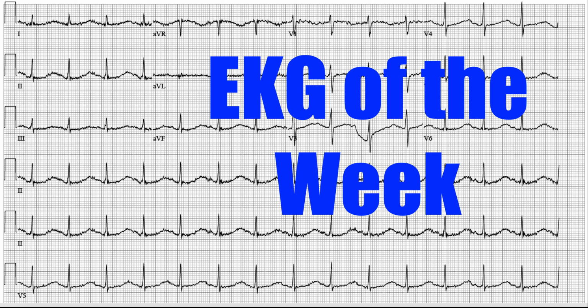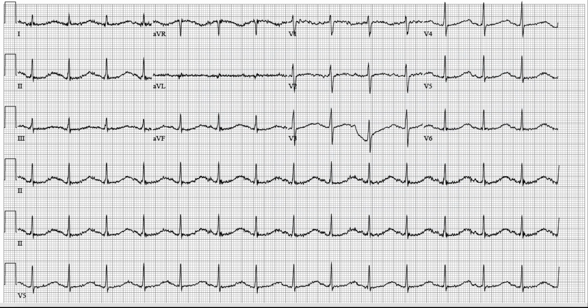Through a real life EKG and pick out some of the finer points and some of the subtle things and some of the not so subtle things and get a little practice on it. So as always, take a minute, pause this video, look at this EKG and come up with an assessment on it, including an impression at the end, but go through our standard algorithm and hopefully you won't miss something. So again, pause for a minute, come back when you're ready.